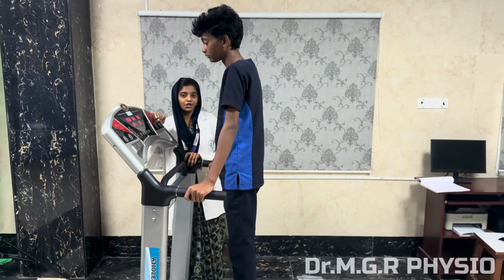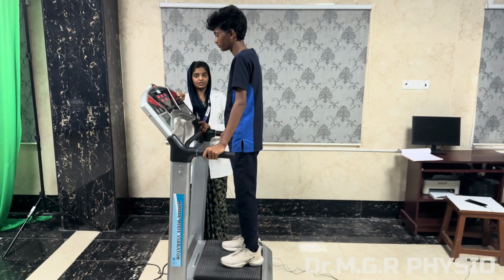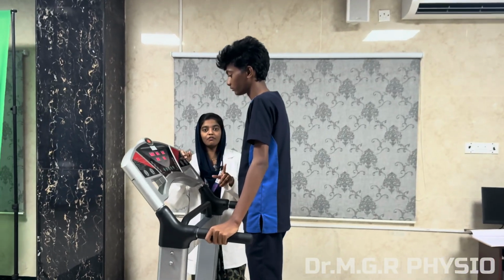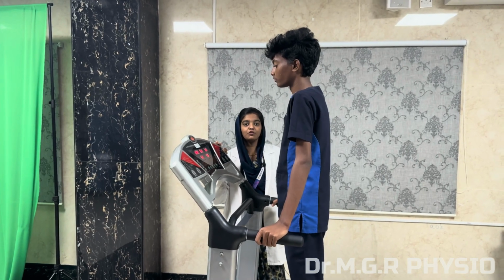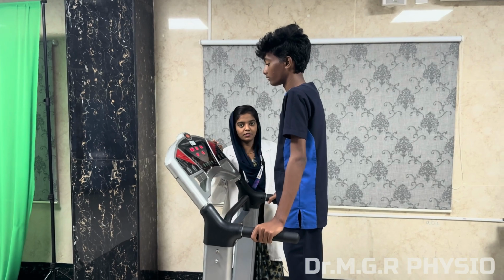According to research, whole body vibrations can be given for a minimum of 10 to 15 minutes, for 5 sessions per week. This machine costs around 1 lakh, and our department gives permission for this machine to be used by UG and PG graduates for their research and publication processes.